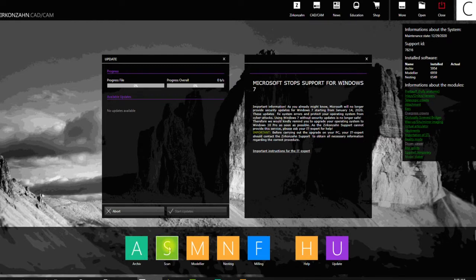The scan is where you line up all your scans. It attaches to the desktop scanner. You can actually attach it to a Trios too. This is the scan program, a lot of good aligning and tidying up, making your scans clean instead of dirty. The Modellier is the program where we do all our designing and making bridges and shaping things. It also happens to be really good for lining things up and trimming them too. So I think we actually do most of our lining up here for the matching that it has.